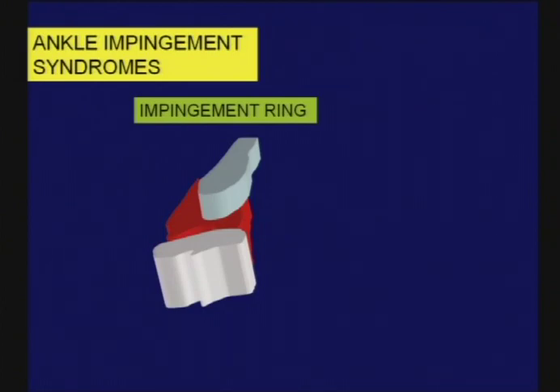I think ankle impingement syndromes are a clinical diagnosis supported by MR imaging findings that may indicate the source of the impingement. There are no definitive features, however, the only exception in my view perhaps being the talar edema that we see with posterolateral ankle impingement. But I think of this a little bit like an impingement ring. You know, we are talking about rings around every joint.